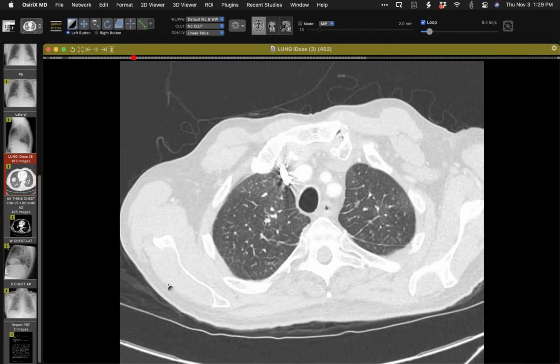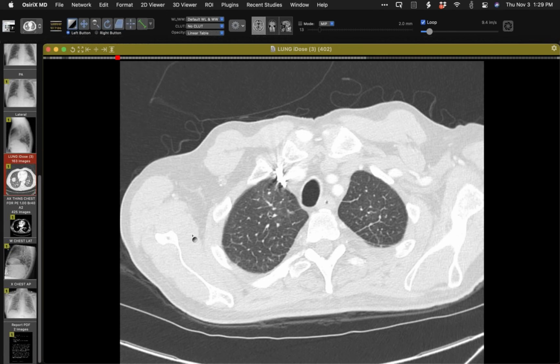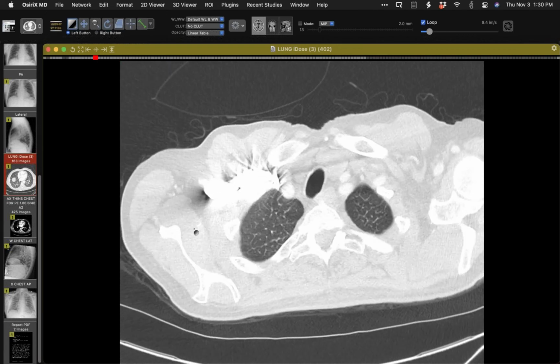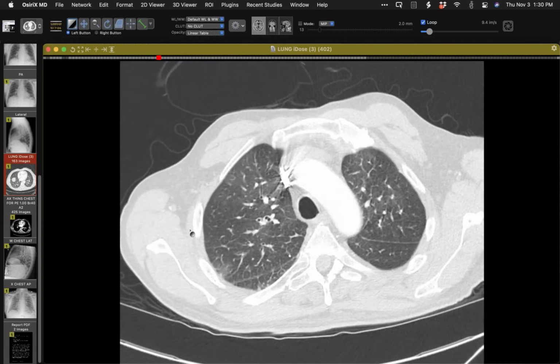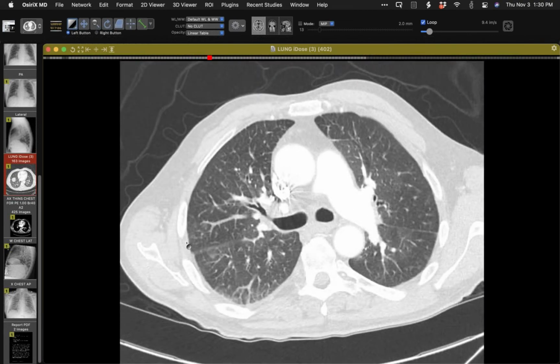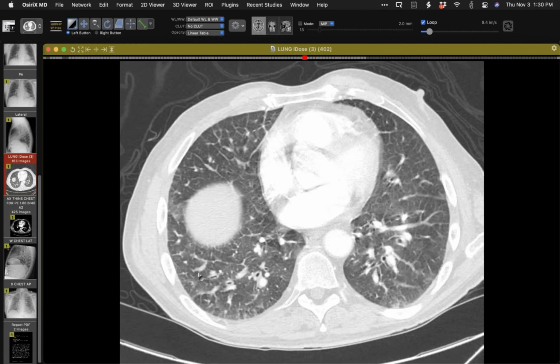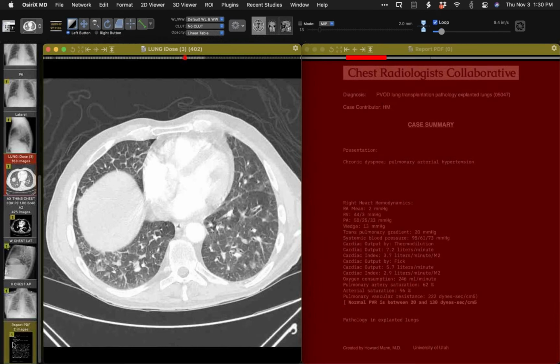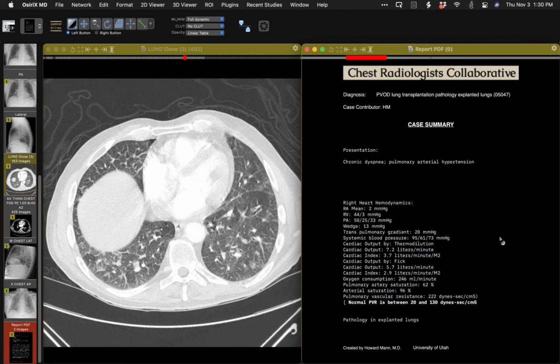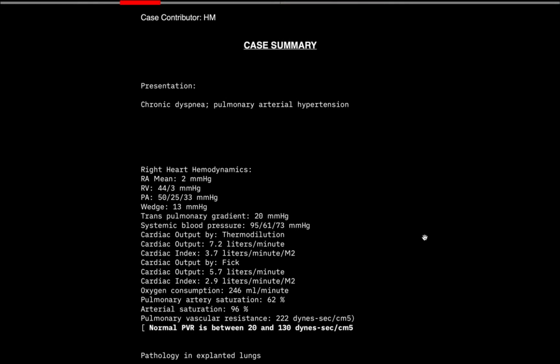Yep. Certainly in that context, one should try to look in between the edematous lung and in between the septal lines for any hint of ground glass opacity, particularly centrilobular nodules that may potentially represent, in the same lungs, of course, pulmonary capillary hemangiomatosis. But I don't see this in this patient. It's just persistent florid interstitial edema. So I'll leave that up.